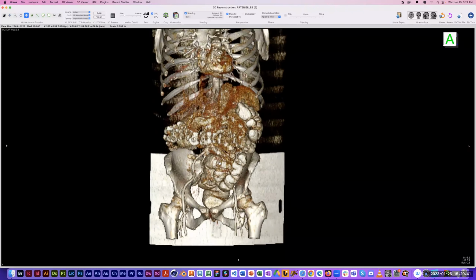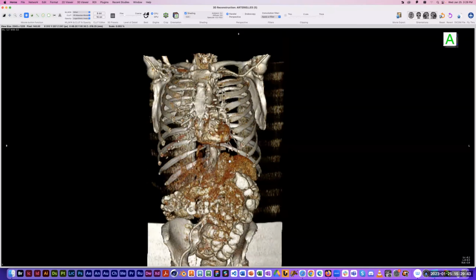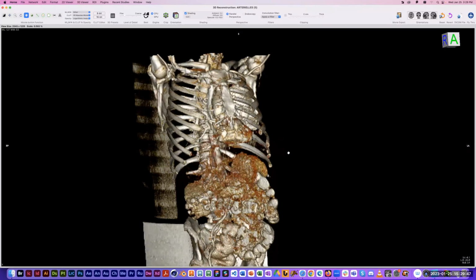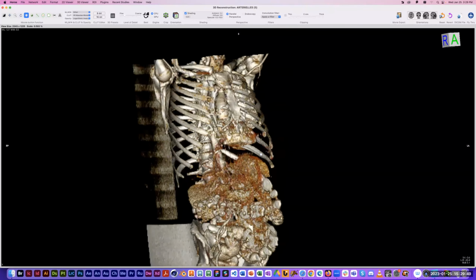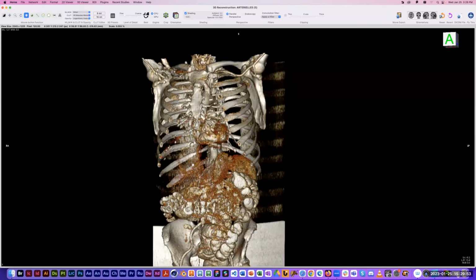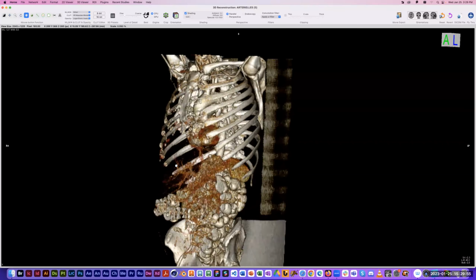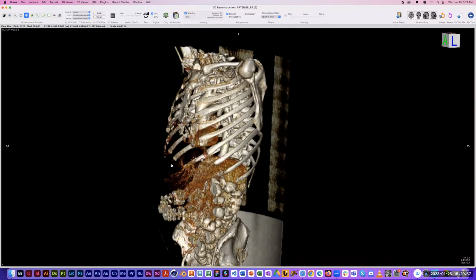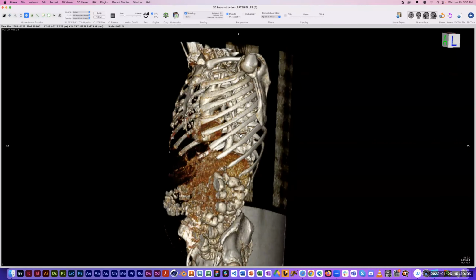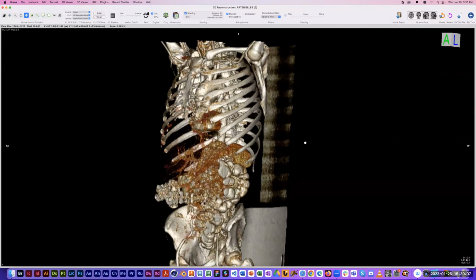As I said, there must be some contrast fluid or something in the colon, because it's showing up pretty distinctly. Higher up, of course, we've got ribs and sternum, and inside the thorax, you can make out the heart pretty clearly. Some of the pulmonary vessels, you can see the aorta in there. The aorta is partly hidden, but you can certainly see the aortic arch way up high in the thorax, and then arching down to become the descending aorta or thoracic aorta.